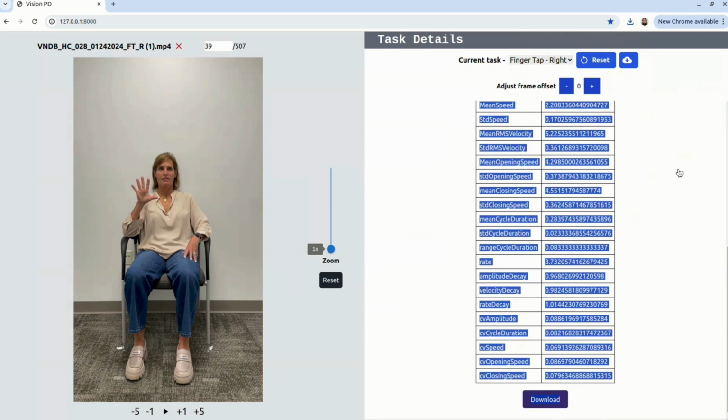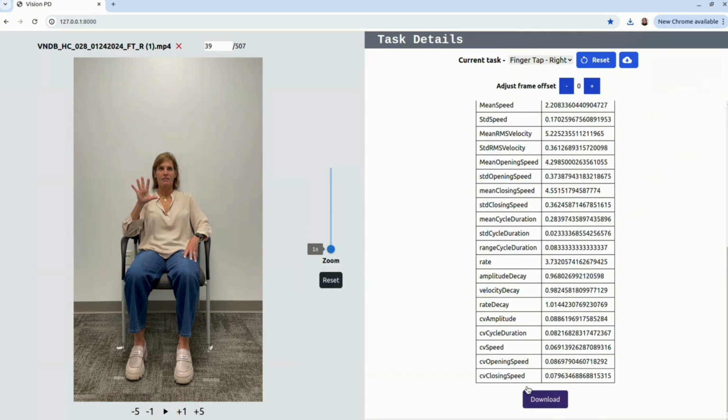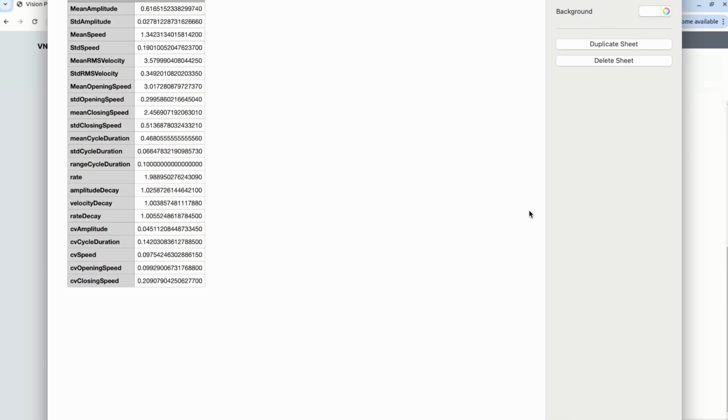When looking at your downloads, you are now able to open up all the files. I will first show you an example of opening up the CSV file. I am opening up the CSV file on a Mac, so that's why it opens up like that.